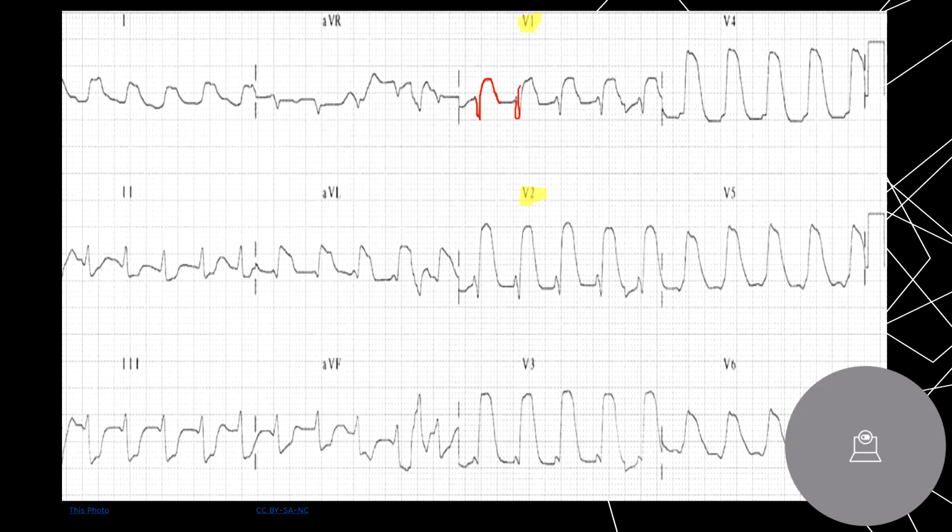So let's find, this is baseline. Where's our J point? It has to be here. Huge elevation. Baseline, J point. Where, like, it has to be here. Baseline, J point. I'm sorry, I said that backwards. Baseline, J point. Right? So you have huge elevation, monstrous elevation here.